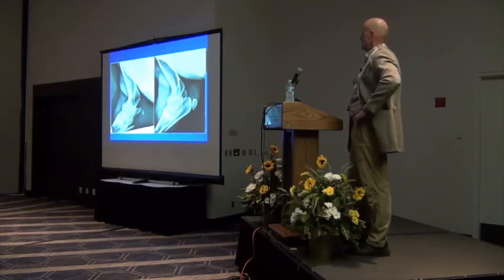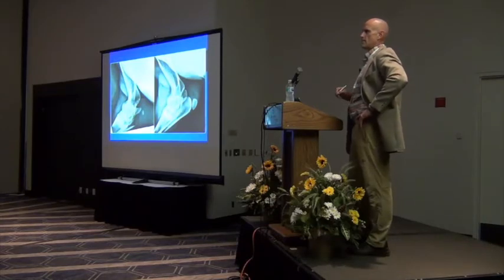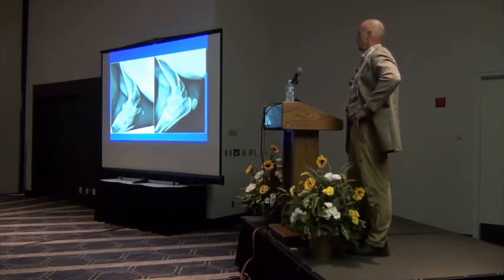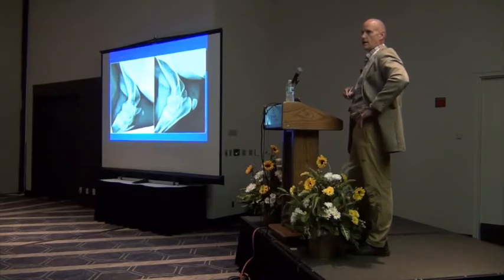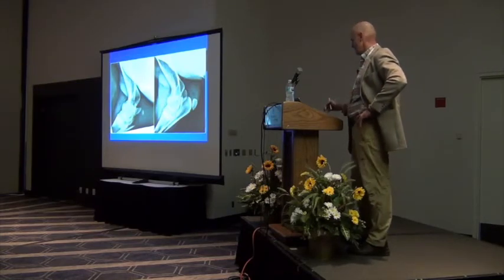What's going on here? My resident came running to me and says, this horse does not have an olecranon. They're burning it out, right? So, North Carolina. Yeah, North Carolina. It's possible. Yeah, hypoplastic olecranons.